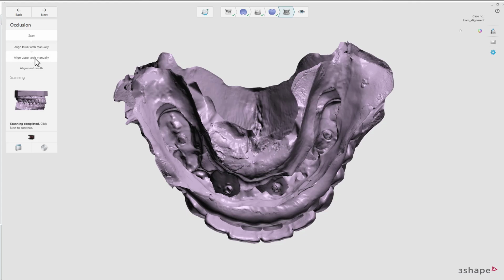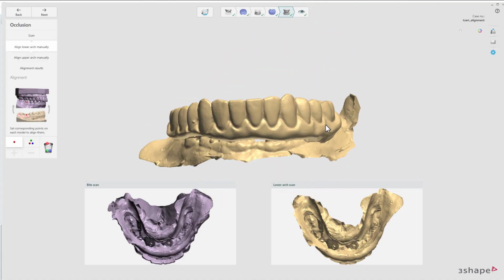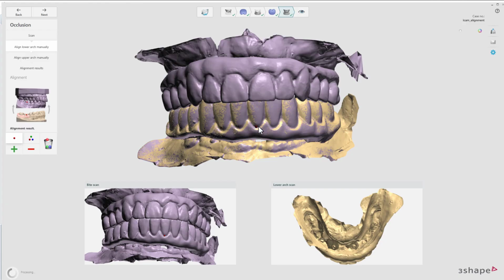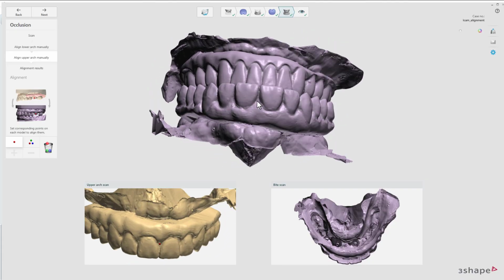So now we got that. We go to the bite. We check the bite register, the bite, how it came in. Most likely it didn't like it because it would have probably already been checked. So let's do the lower. Now we could probably just do one dot on this because, yep, bam. From here, do the upper.